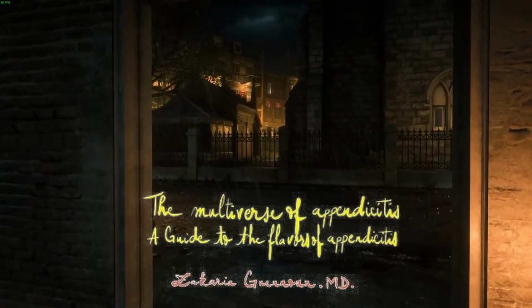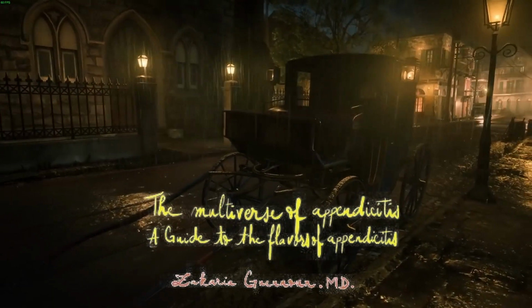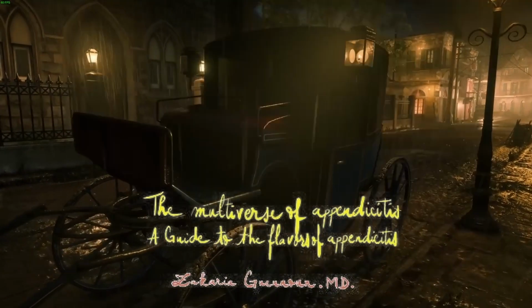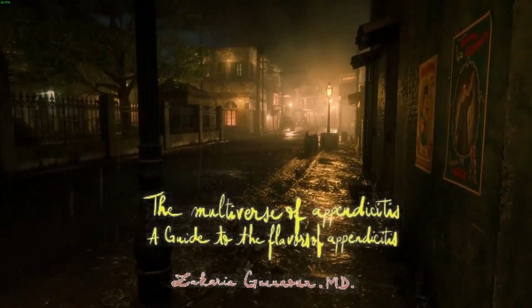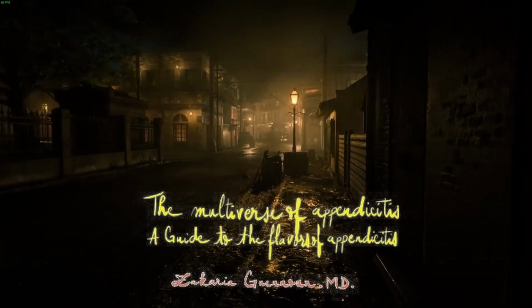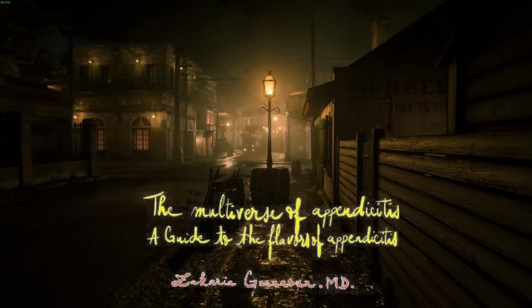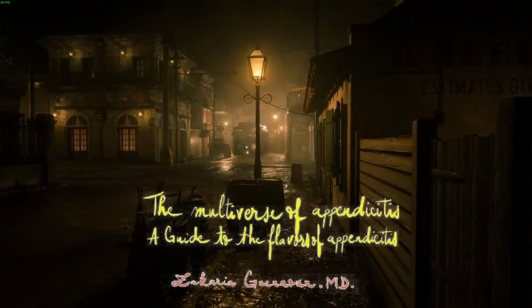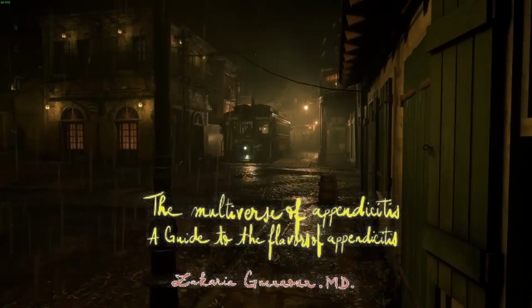The appendicitis can also be secondary to an inflammatory process. The differential includes Crohn's disease, colitis, and the management, of course, will be different from primary appendicitis and is usually, at least initially, managed non-surgically. Sometimes the appendicitis involves only the tip, and it can complicate, same as an appendicitis involving the entirety of its length. I mean, tip appendicitis can perforate, hence it's important to follow the appendix to its tip either on ultrasound or CT.